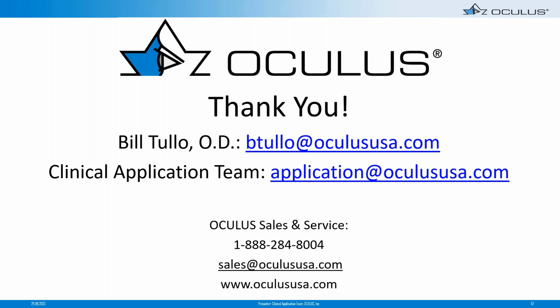Alrighty, so the next question I have for you, since we've seen so many of those images on contact lens patients with fluorescein, can you have fluorescein in the eye before doing a Pentacam scan? Fluorescein is problematic in the Pentacam. Number one, because it causes reflection. The Scheimpflug image will be altered by the presence of fluorescein in the tear film. So we always recommend taking the Pentacam scans before any application of fluorescein.